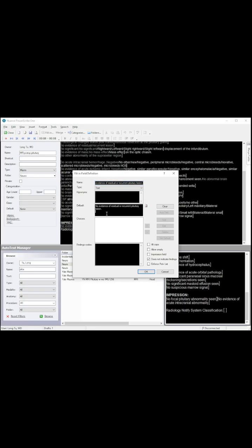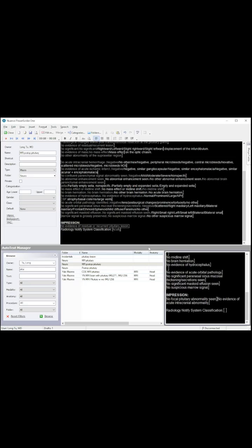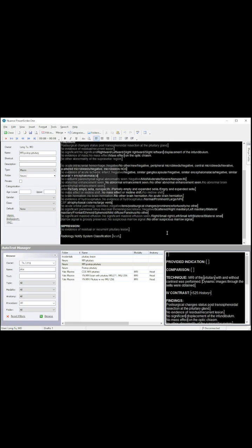It looks like this has an extra line here. As you can see, I lost a line in the appearance of the template back here, because it got pulled into the template. So I'm going to delete this here, just make sure that's not here. Good. Okay. And then just add that line back in. We're going to save it.